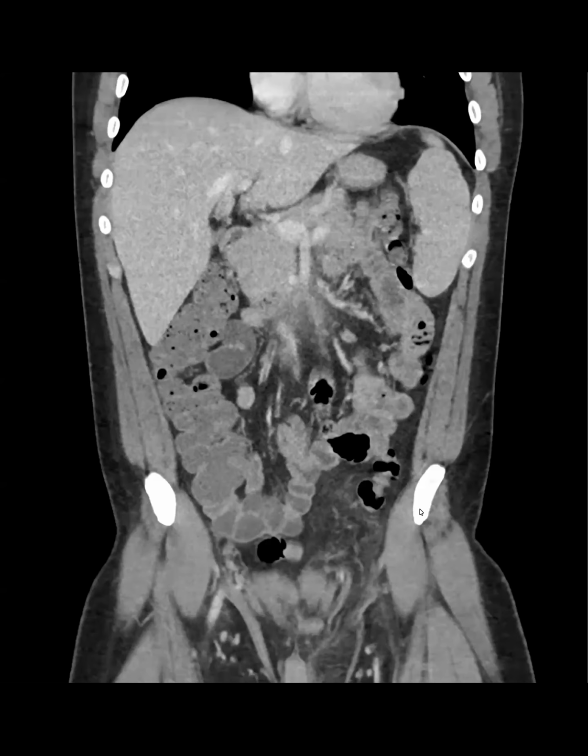Right. Those were the exact same differentials we gave. It's either an IPMN with malignant transformation, or she's female, and although MCNs would still be more body and tail, this is unusual location-wise. One other thing we mentioned was a main duct IPMN, because the MPD was also significantly dilated. Same conundrum: whether it was obstructed and hence dilated, or dilated by itself, we couldn't tell. So they did do EUS, and surprisingly, this came back as a myxoid spindle cell sarcoma of the pancreas.